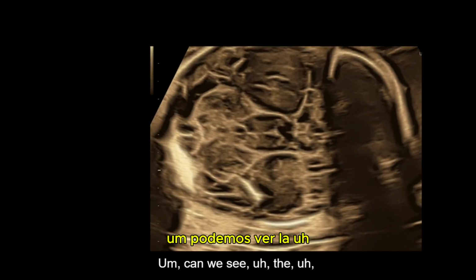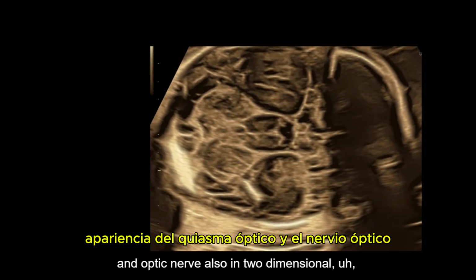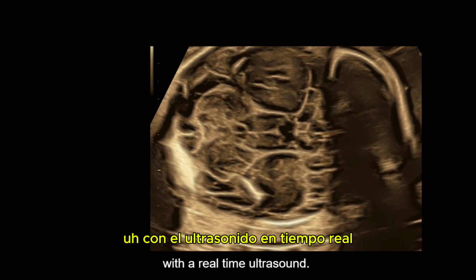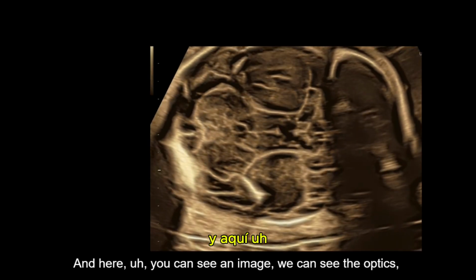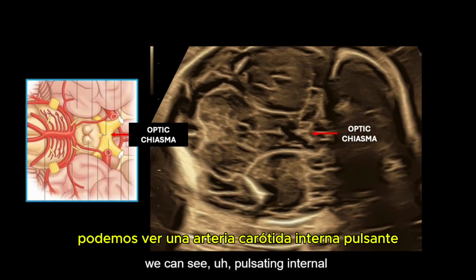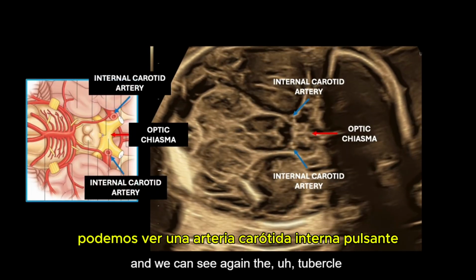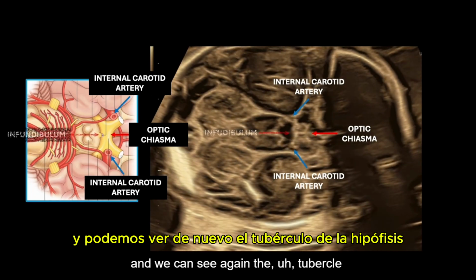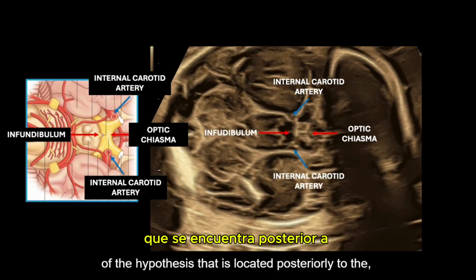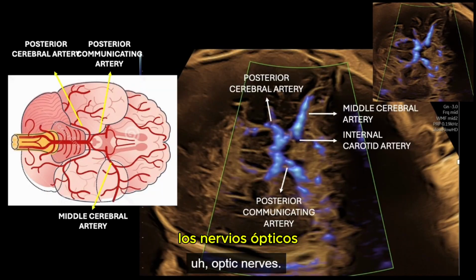Can we see the appearance of the optic chiasma and optic nerve also in two-dimensional with real-time ultrasound? And here you can see an image. We can see the optic chiasma, we can see the pulsating internal carotid artery, and we can see again the tubercle of the hypophysis that is located posteriorly to the optic nerves.